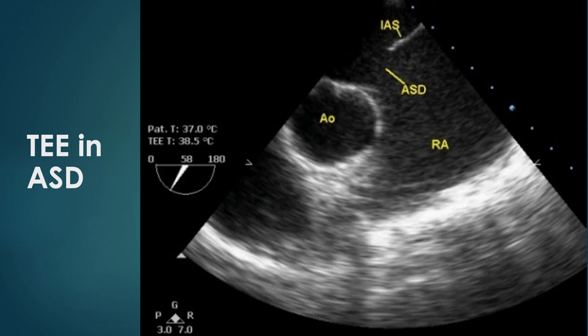Transesophageal echo probe, being very near the heart without any intervening lung tissue, can give excellent images. Moreover, the short distance permits the use of higher frequency transducers with better image resolution. Usually, higher frequency transducers cannot be used for transthoracic echo because of poor depth of ultrasound penetration at higher frequencies in an adult.